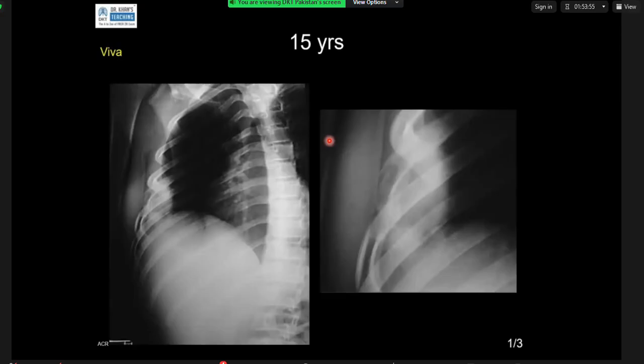I can see some surrounding soft tissue as well. So yeah, this is with a wide zone of transition, some periosteal reaction. I would think of an aggressive bone lesion, infection, and it looks like it is a 15-year-old child, so I would keep the differential less likely.